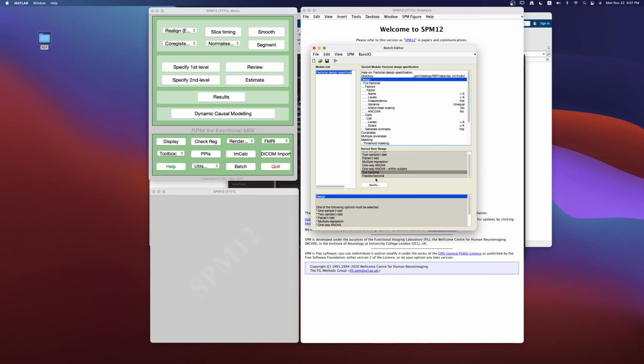You can go ahead and explore. When you click on it, there are different ways to enter the data, but you should spend your time figuring these specific options out. The most generic case that we can use is the full factorial option, so I'm going to select that. And then we realize that we have 2 factors. We have the condition, or the repetition condition, which is the first time, second time, or third time, and then also another factor called age. So we need one factor in our design and another factor, 2 factors in total.